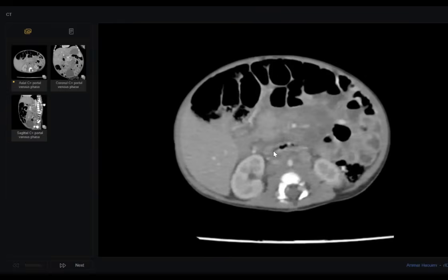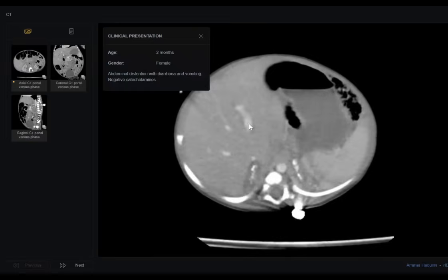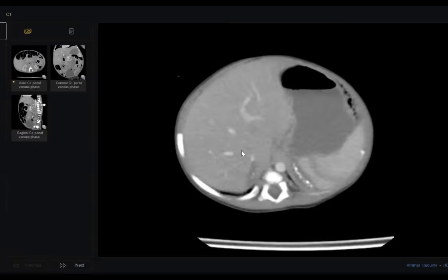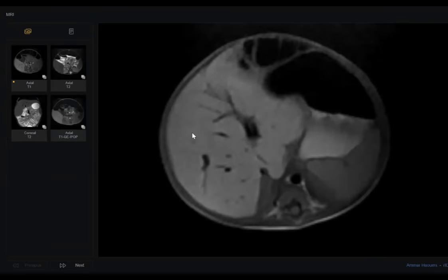Okay, why is this not lymphoma? Because I think the age of the patient is very young, 2 months, and lymphoma is not common. Second point, the calcification here in the suprarenal indicates other diseases than lymphoma, like the list we just mentioned. I will add 2 points here.